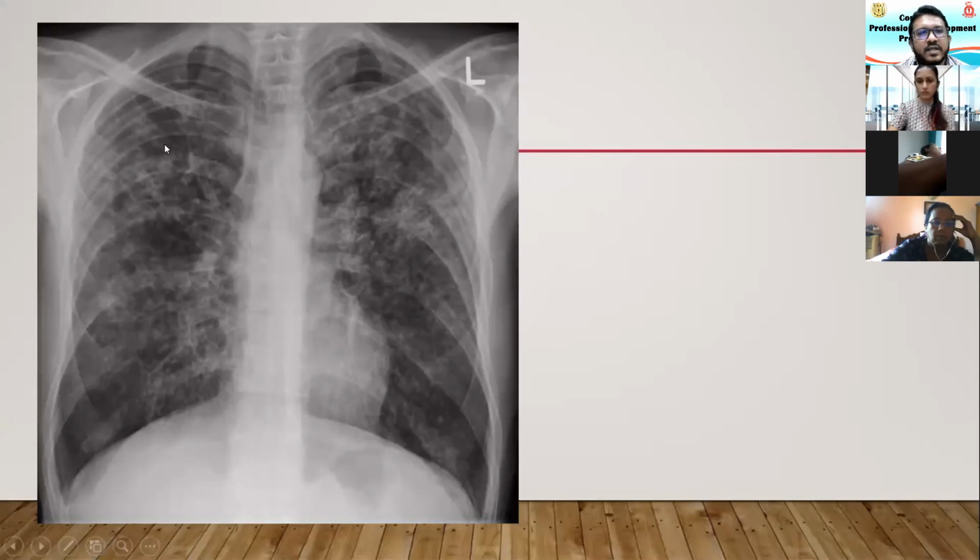So ground glass is like increased density of the lung fields. The common finding now would be COVID, and there are certain other infections, and conditions like pulmonary fibrosis. Initially, you would end up in ground glass, then leading to the fibrosis. Those are the things that you will get.